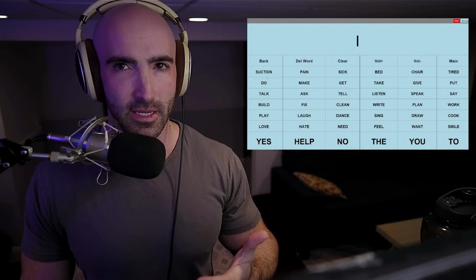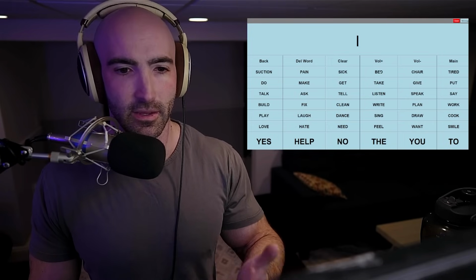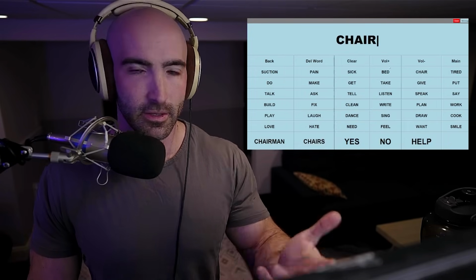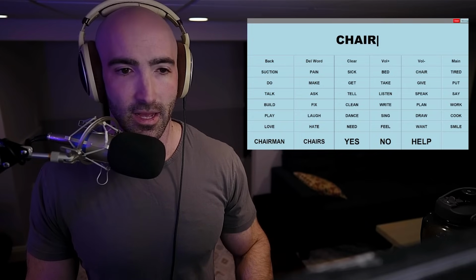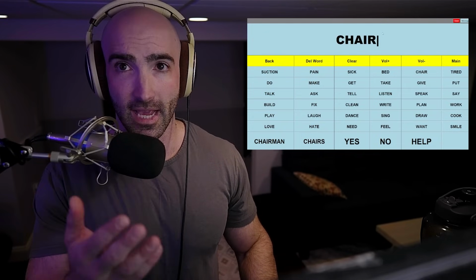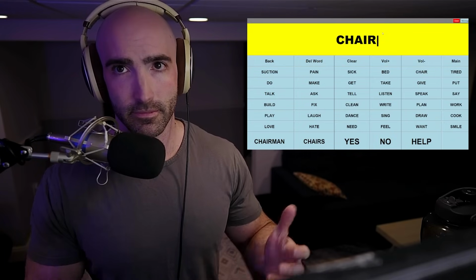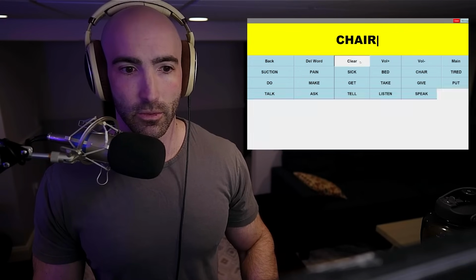So the things that he needs most of the time are like suction, because he secretes a lot. Suction, he's in pain, he's sick, he wants to go back in bed. The chair, it'll type it for him. And when he clicks on the actual text bar, it'll say it for him. Chair. So it's really cool.